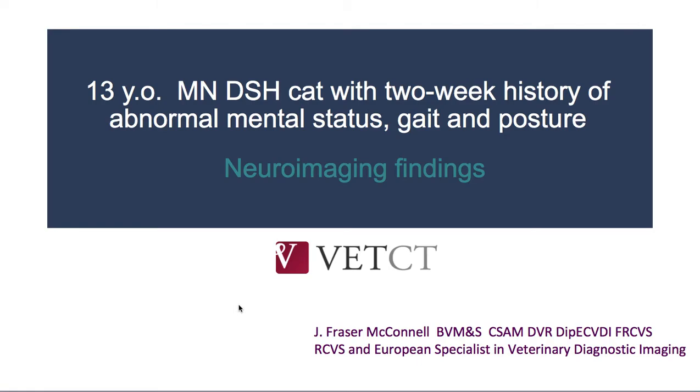And we've got another fabulous case from Elsa this week. So this was the 13-year-old neutered male domestic short-haired cat with a 2-week history of abnormal mental status, gait and posture. So let's have a look and see what the MRI showed.